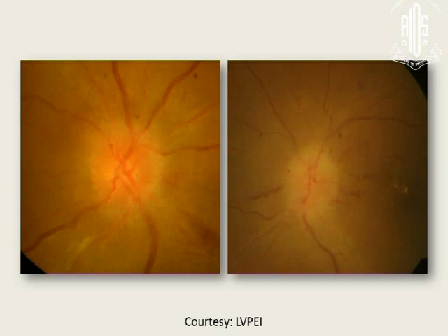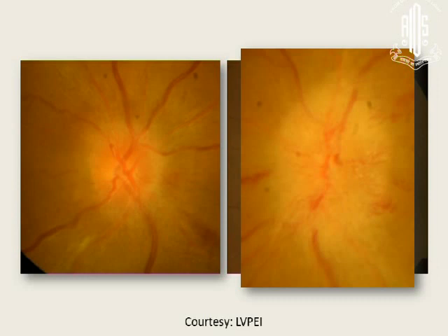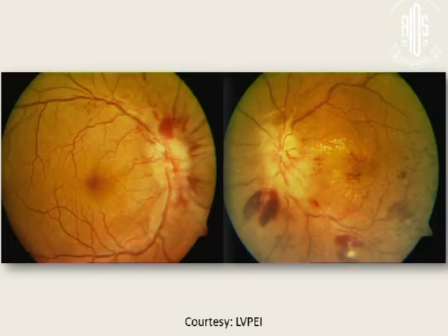In addition to all other signs, this pallor of the neuroretinal rim indicates that this is a long-standing true edema of the disc. And if you take a closer look at this disc, you will see these deposits. These are long-standing deposits. These are also called pseudo-drusen, or optic disc drusen. This is another example of bilateral disc edema. This is true disc edema, and Dr. Satyakarna will tell you whether this is bilateral papilledema or bilateral disc edema, which is not papilledema.